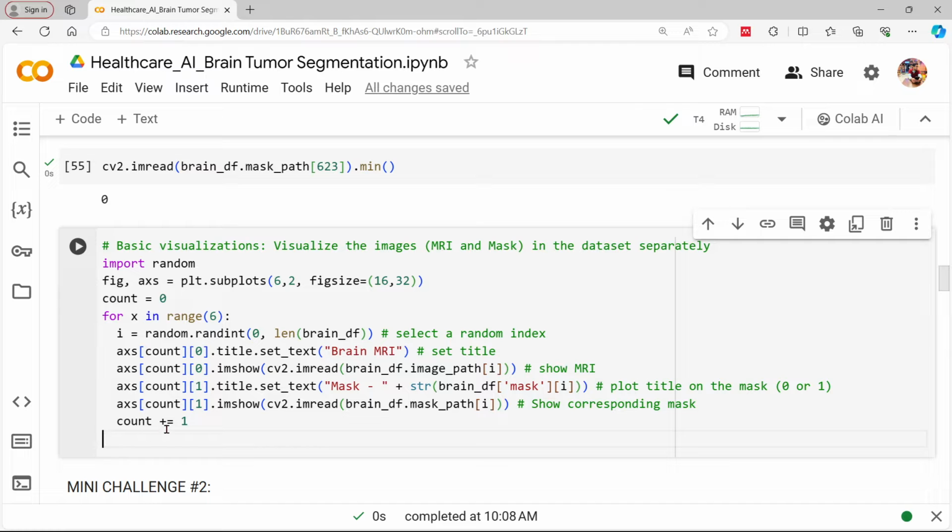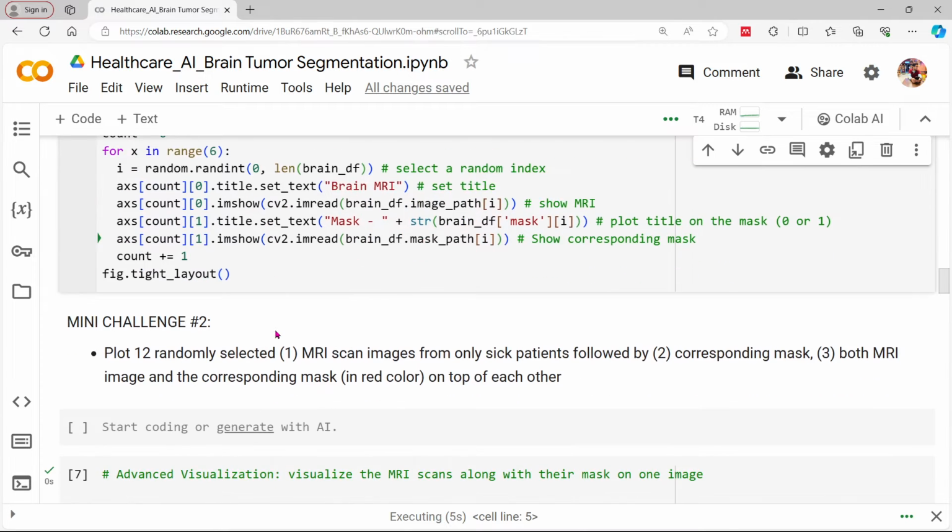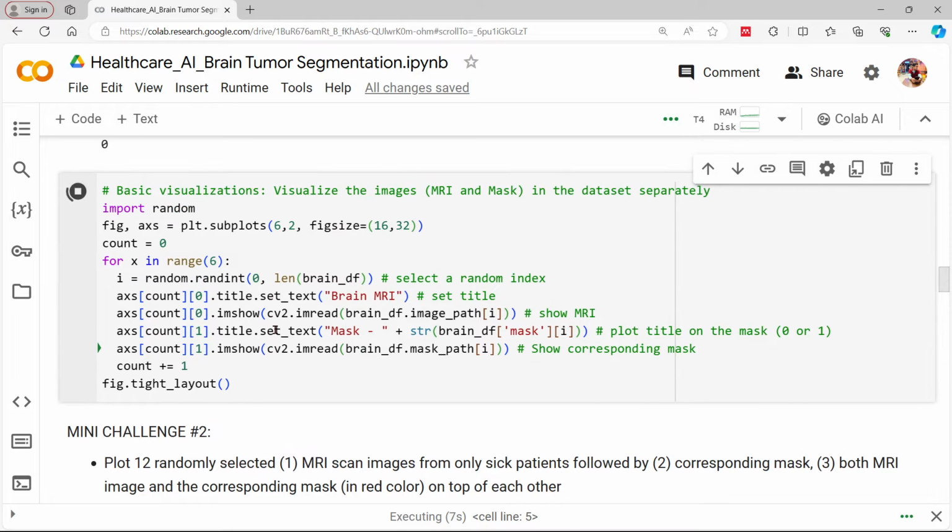So I'm going to display the part here. This will visualize my images, and it will be very clear to you that you have so many images there along with their masks, right? And you can use this one. So it's taking 1 or 2 minutes. Of course it will be taking.